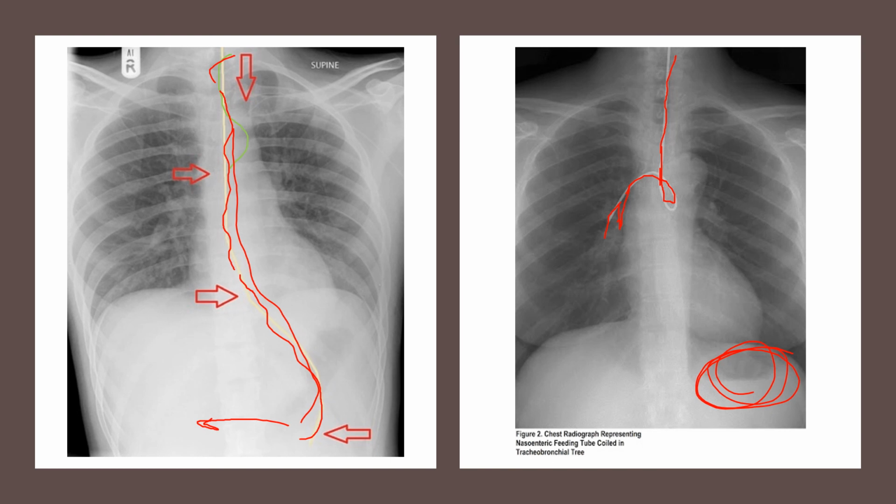So now let's say we started tube feeds and these tube feeds are dumping into the right lower lobe. Do you think that could cause a pretty significant pneumonia? Absolutely, right? The lungs aren't designed to absorb all that good quality nutrition through their tissues. So that's something very, very bad, and something you want to pay attention to. So that's the E's. Make sure there are lines in the esophagus, and that if there is something in the esophagus, it terminates in the stomach.